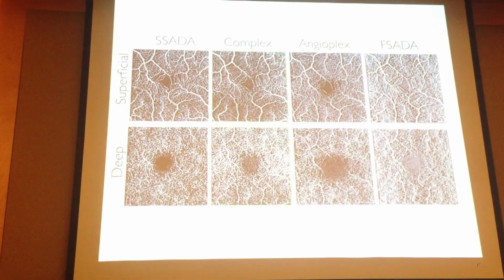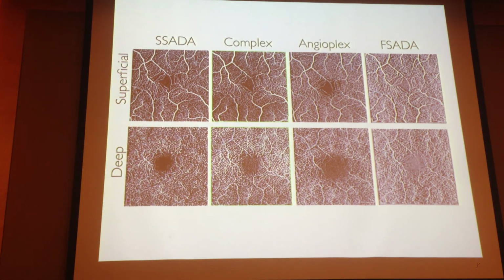This one, for example. Here, in this little avascular zone, there is no flow, but sometimes you're going to see the white dots. Yeah, and that is actually, of course, an artifact. And it's not always clear. For example, if you use the Heidelberg, it's even more evident. But it can be just a contrast effect.